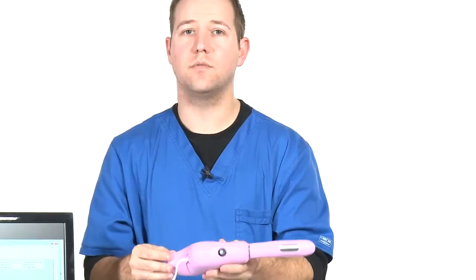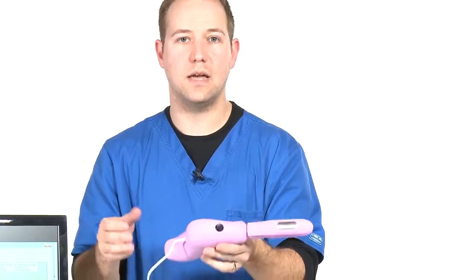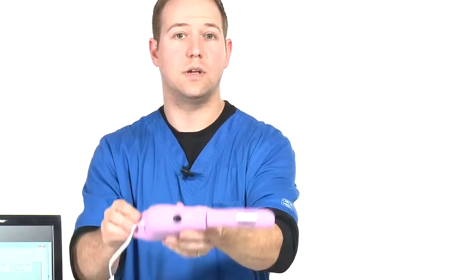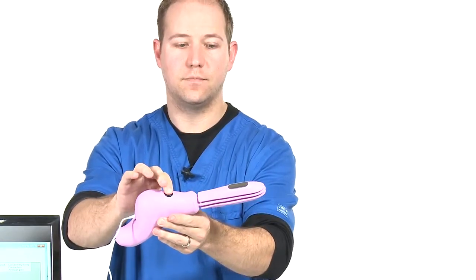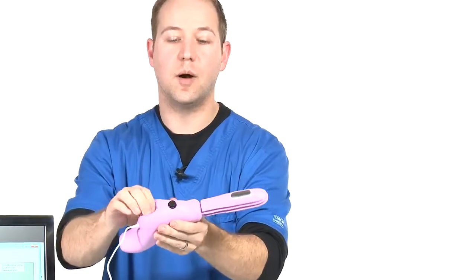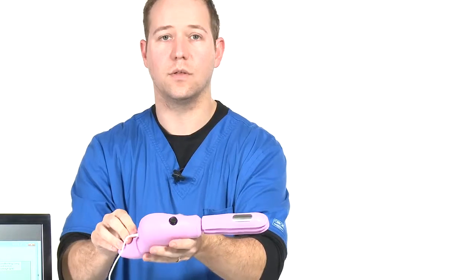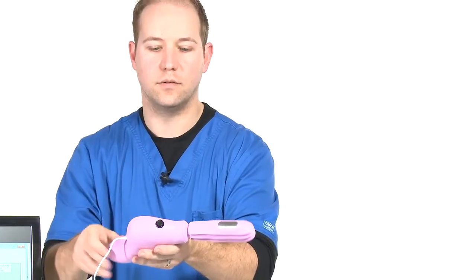So when the patient comes in for their initial setup, they're always going to have questions. The best way to handle all these questions is to introduce them to their InTone. You can hand them the device, show them how to pump it up, how to deflate it. They're going to ask about what is their appropriate level of pumping up the device. Can I overinflate it? Do I underinflate it? So on and so forth. You just want to make sure that they pump it up to their comfortably snug level.